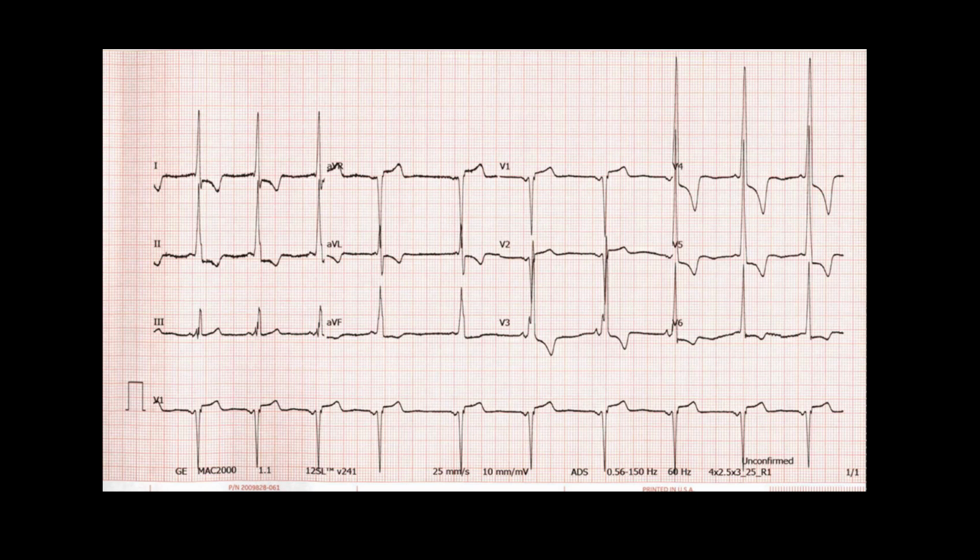But when you're looking at this patient's ECG, you can tell pretty clearly that he or she has the hallmark of left ventricular hypertrophy. Their QRS complexes are massive, which makes sense because they have a big left ventricle, so they're going to be producing more energy. And they're down in V1 and up in V6, which is classic. You have the discordant T waves. If you look at your EKG, your T waves in almost every lead are on the opposite side of the QRS, and you can see that the ST segment is going with the T wave. Again, that's what I would expect.